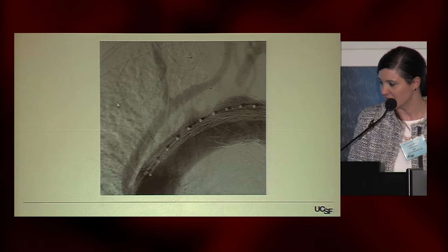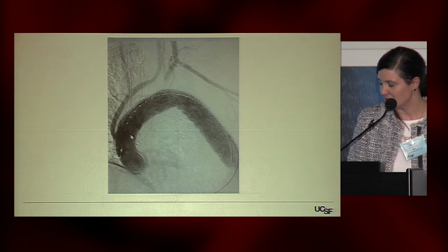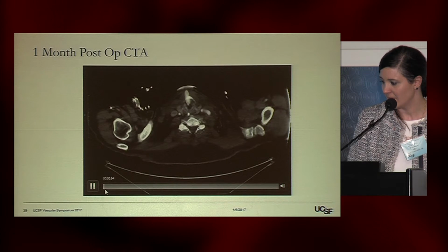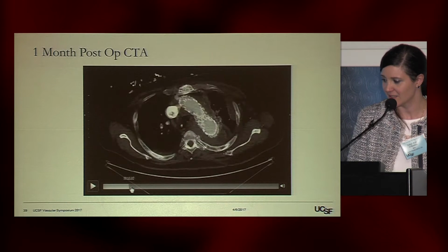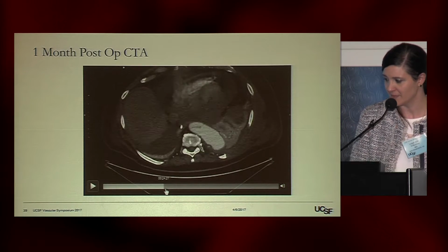So you can see here, this is our graft coming off the ascending aorta, landed just distal to this, and we put him on lifelong antibiotics. And this is 1 month post-op. We've got a nice seal.